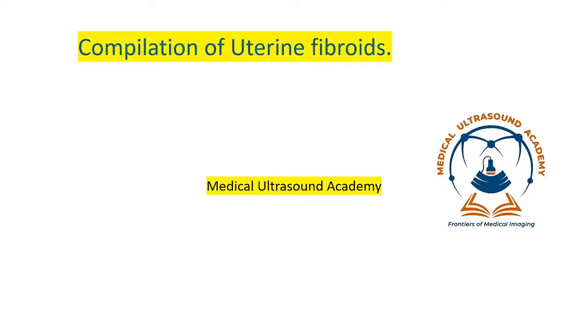So we are going to have a compilation of all the pelvic pathologies. We are going to do it stage-wise because there are too many, we can't do them all in a single presentation. So we are going to sub-categorize these different pathologies.